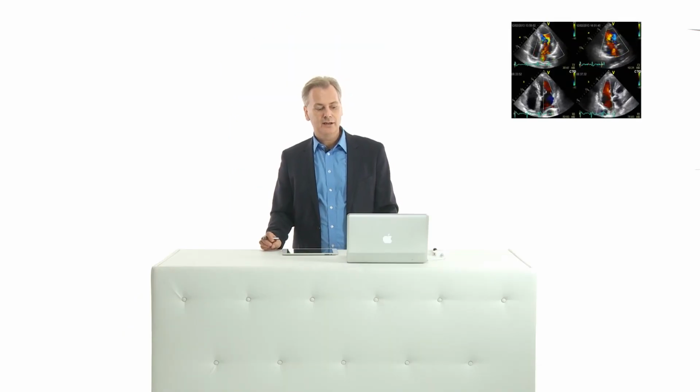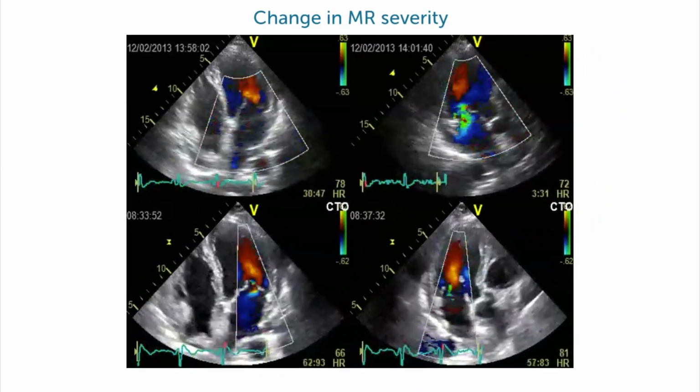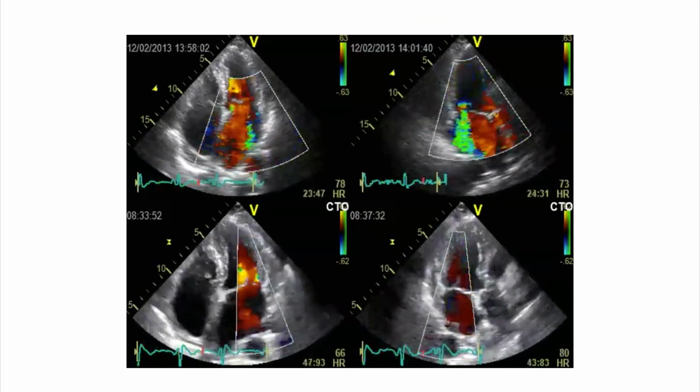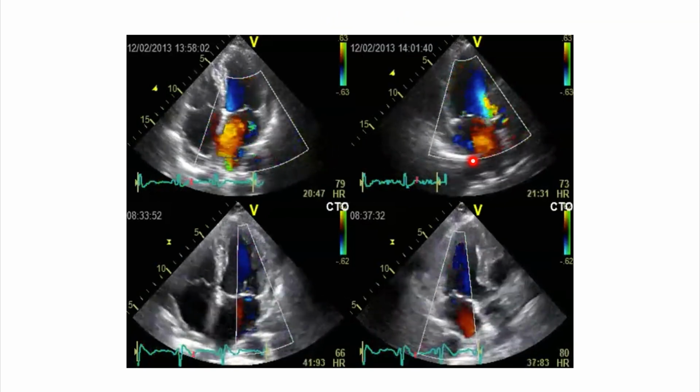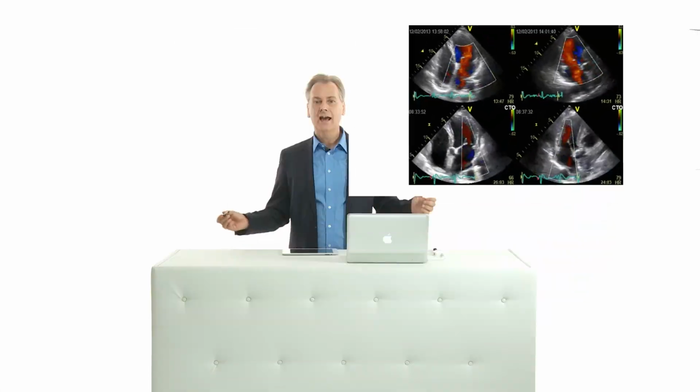Here's an example that demonstrates that. A patient who was on chemotherapy, and the 2 top images show the echo that was performed during chemotherapy. Probably due to some subclinical form of left ventricular dysfunction, and maybe even to volume overload, this patient now has relatively severe mitral regurgitation. Clearly there's jet here and here. And then after only 5 weeks, the patient came back and almost no regurgitation was seen. So keep this in mind. Regurgitation is something, especially in functional regurgitation, that comes and goes.